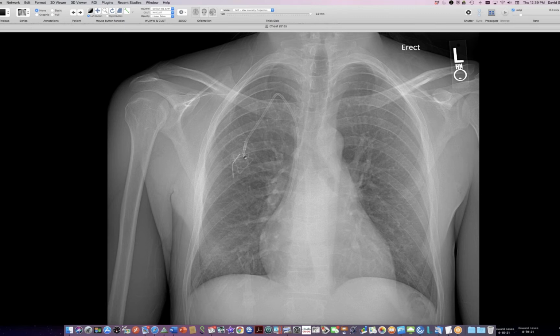I don't know whether the needle adjusted somewhat between the radiograph and the time that they used it, or what happened, or whether this is somehow a misreading of this geometry. But you should always be very alert to making sure that the needle is not outside the port before they inject, extravasate, and then cause tissue necrosis. So does anybody have an explanation that would make this not alarming?